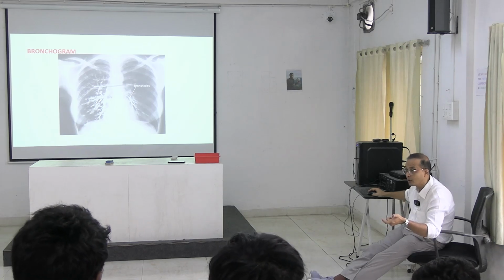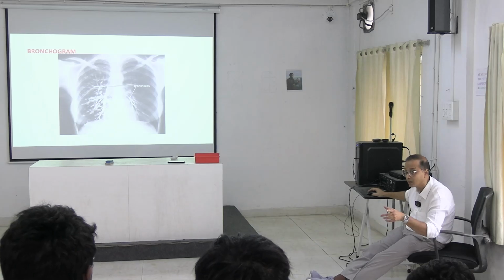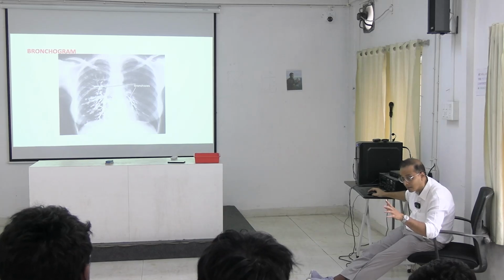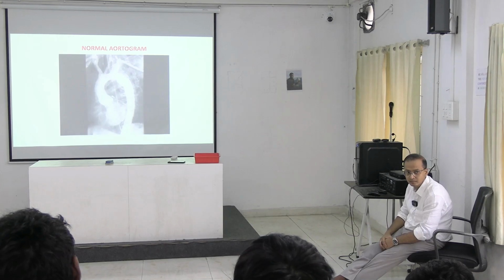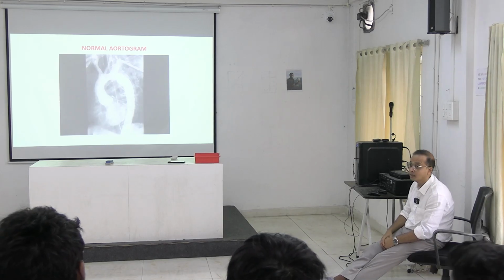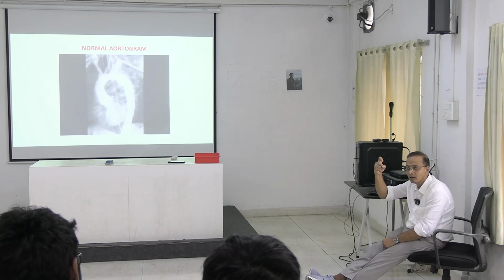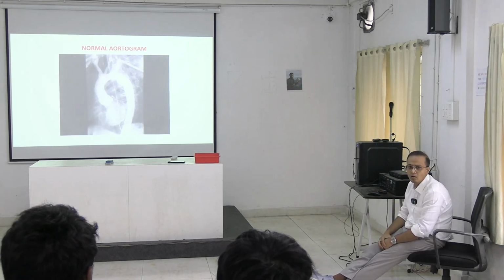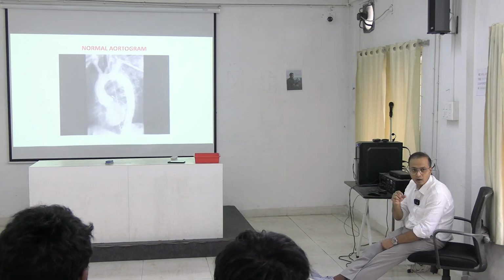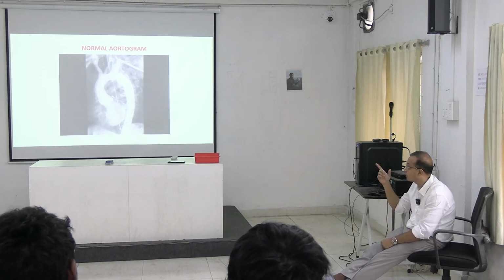Clear? If you are going to see some arteries, what do we call that? Arteries inside, we call them an arteriogram. You are seeing what? Aorta. So you see the vivid parts of the aorta. Before that, what did you used to see? Knuckle only. Here, what are you seeing? In and out of the aorta: ascending aorta, arch, descending, and branching of it as well.